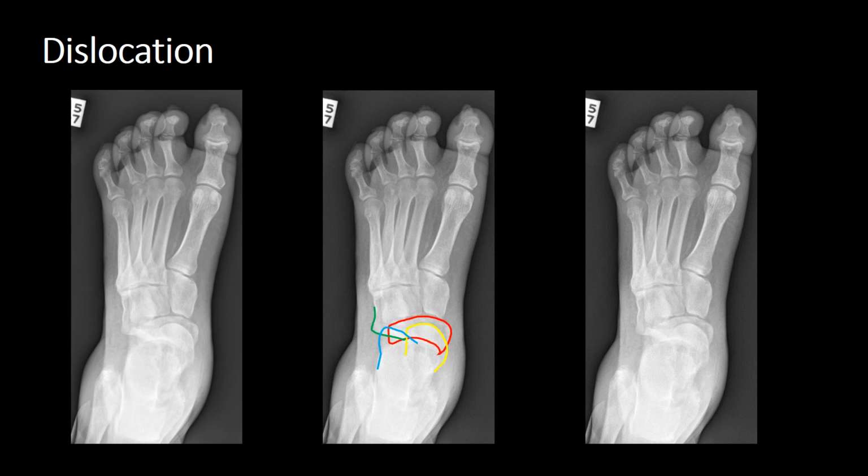Okay, so let's have a look at this image, and what I want you to pay attention to is the joint space. If we look at the first tarsometatarsal joint, we can see a nice even joint space. We can clearly see a gap through it. And if we look at our medial cuneiform in alignment with the navicular, again the joint space is preserved. But after that, it all starts to get a little bit complicated.